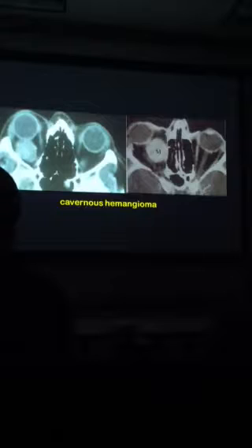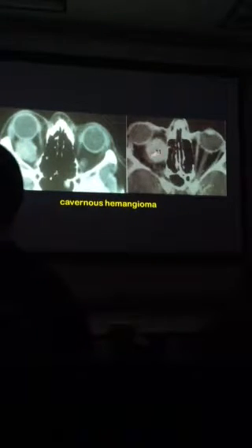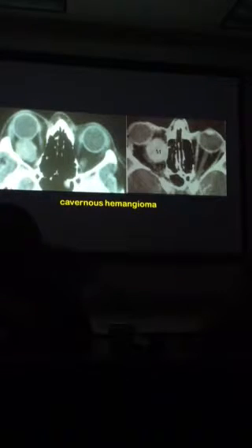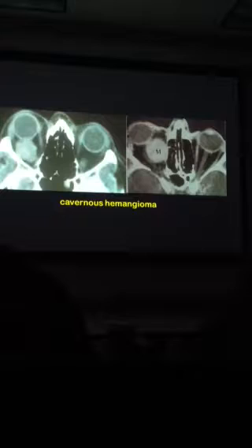You can get hemangiomas behind the eye. Again, remember, they're just big collections of capillaries. Again, pushing the globe out, so he's probably having pain, probably visual disturbance because it's probably sitting right on the optic nerve here. It's benign, but I'm sure it's causing visual problems. Is cavernous just where it's located? Cavernous just means large. It just means large hemangioma.